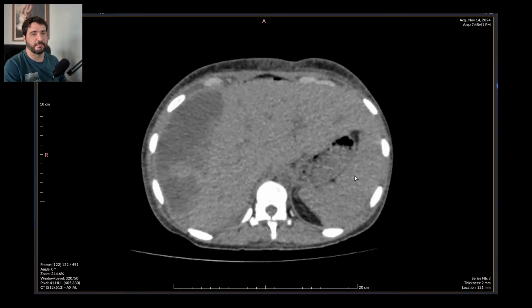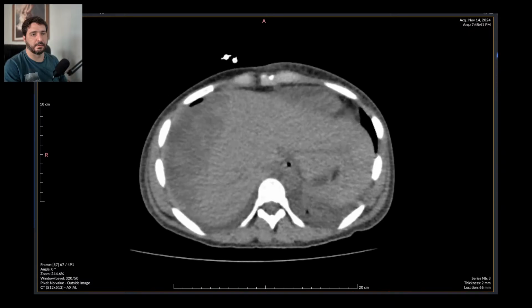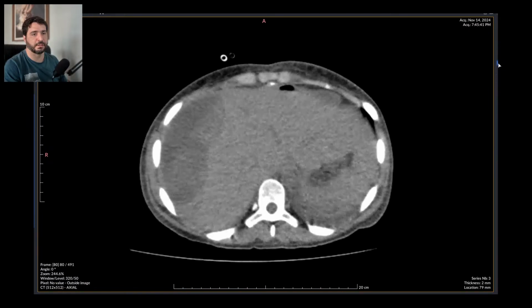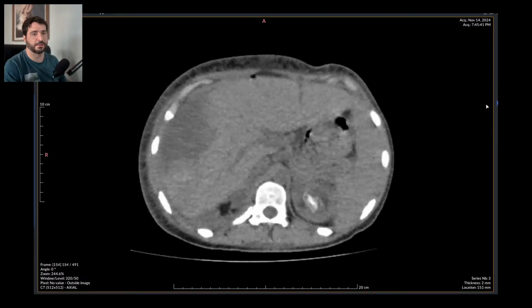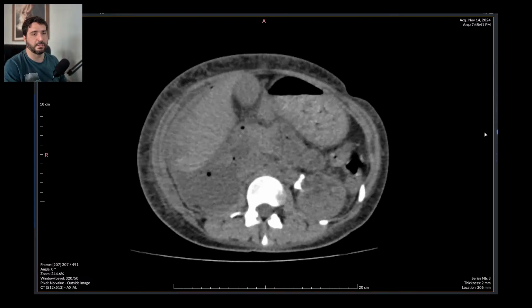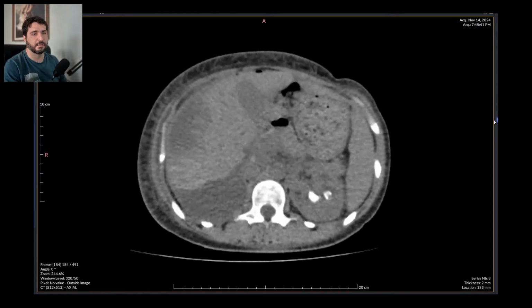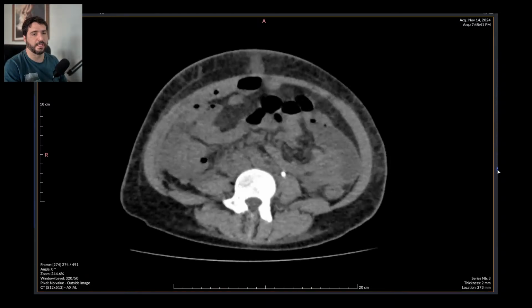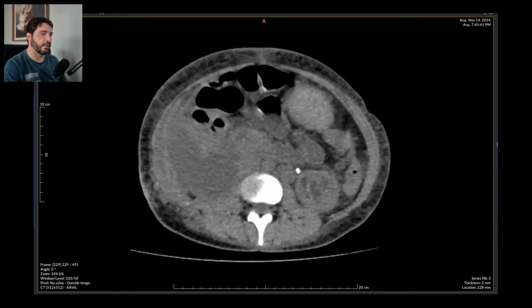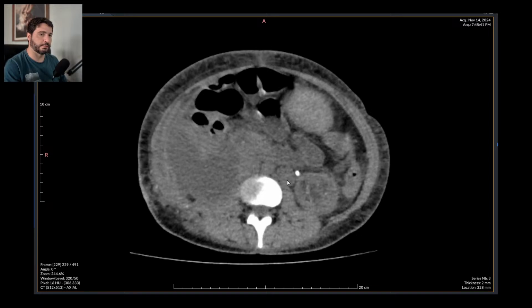We probably have some kind of spleen necrosis, because the spleen is really heterogeneous, but it's so shaky I can't be sure. So I'm not going to risk that, because it's really easy to be wrong, and an exam is this bad. So we are going to be really brief and objective with such a report.